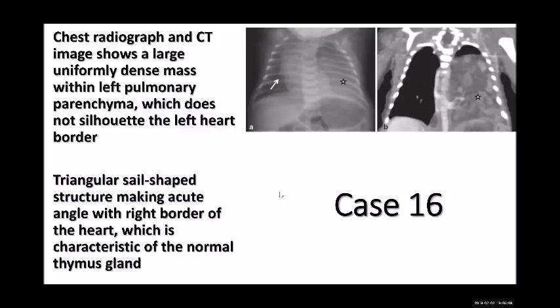And I don't see bronchogram in the left side. What else? So in short, can you give me a short sentence about the case? I think maybe emphysema, because everything is shifting to the right side. Remember, he presented with dry cough.